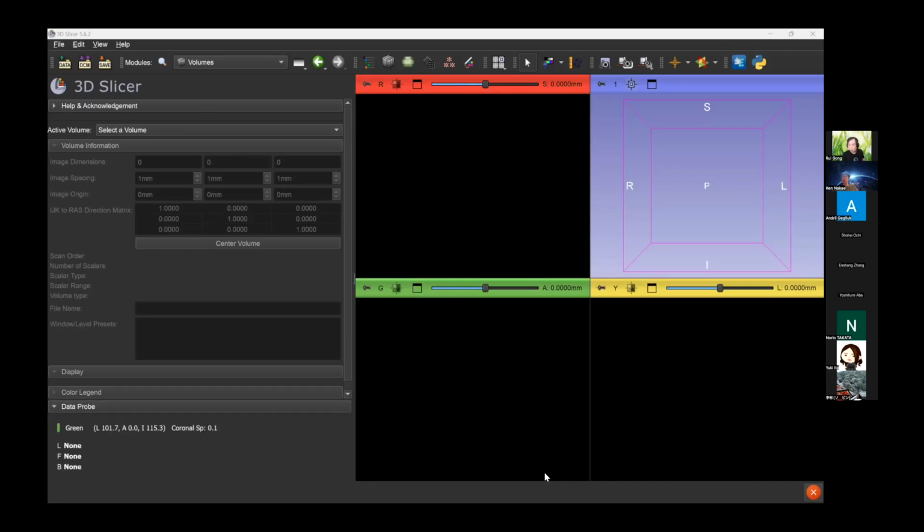Yeah, I can see your slicer. Will you share the slides or PowerPoint? I don't have any slides. Okay, so only through the slicer.